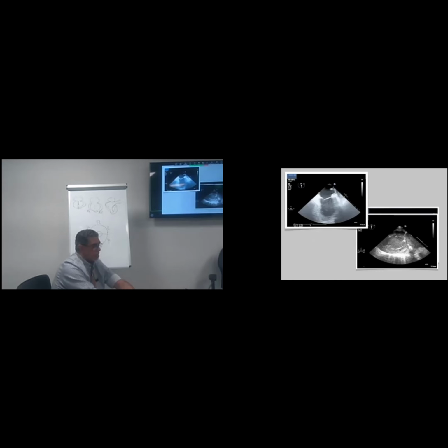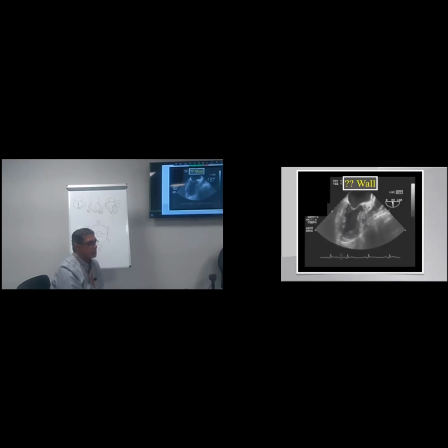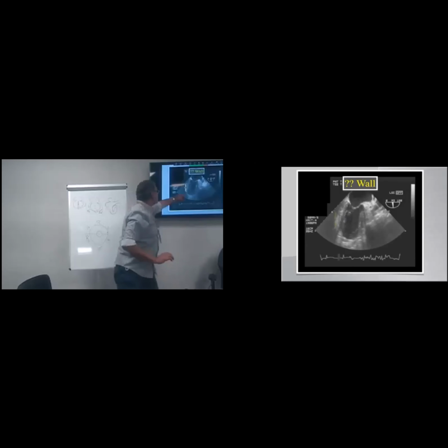What is this view? Can anyone notice? Excellent. One more view. He's smart. What's the name of this wall?